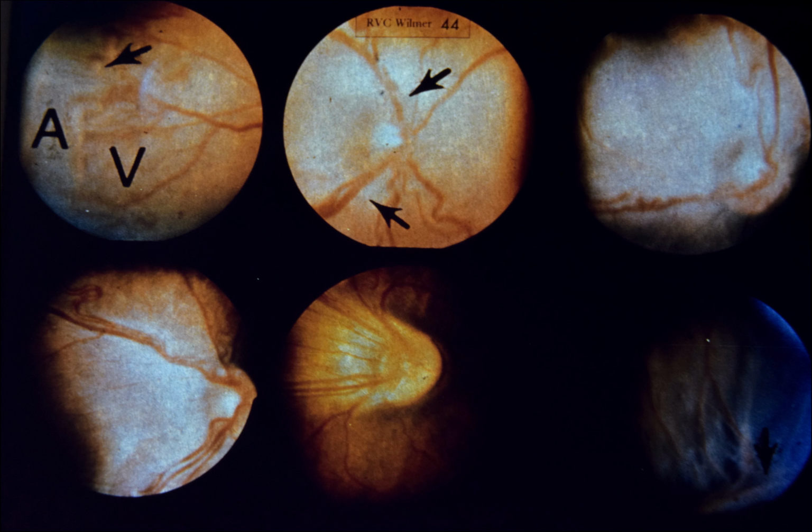Upper center, note dilatation and tortuosity of the major retinal vessels near the disc. Arrows indicate normal arching pattern of the temporal vascular arcade over the macula. Upper right, 3 weeks after previous photographs were taken, traction from temporal periphery has straightened major temporal vessels so that they now take on a V pattern instead of the normal arcuate appearance. Lower left, 3 weeks after photograph on upper right, note further traction on temporal vessels.